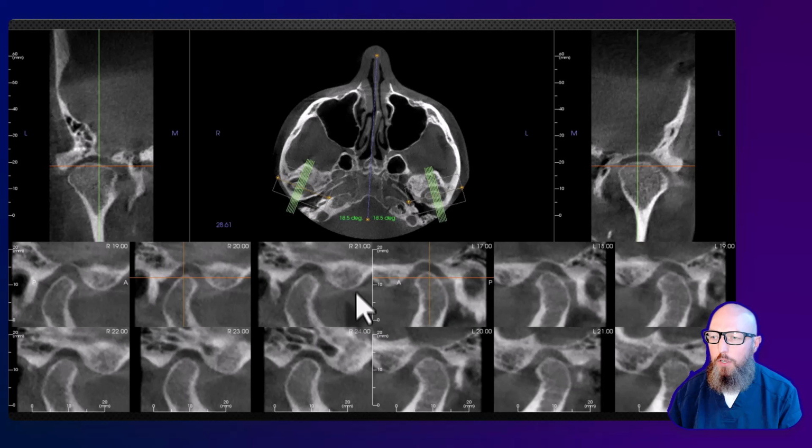And then I'm going to show you some examples from my practice going from less to more severe osteoarthritis. And in fact, this one I would not call osteoarthritis. Maybe there's a little bit, just some mild flattening. That could just be anatomical or just some physiological remodeling. And so look at the nice cortical outlines. Some people might argue there's a little anterior beaking here. I think that's a little aggressive diagnosing if you call that an osteophyte. This just looks like a normal temporomandibular joint.